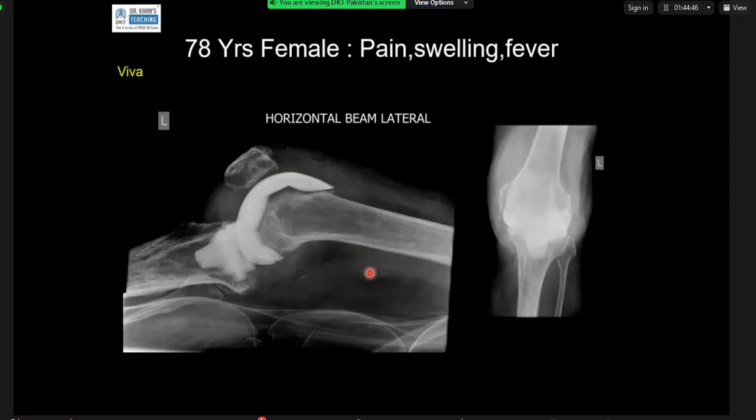Then I can see an interrupted periosteal reaction involving the medial portion of the femur with an ill-defined lytic lesion in the distal femur, corresponding to the anterior cortex. You're talking about this area where I'm pointing out? Yes, sir. So this is also projectional. This is similar to this. This is quite a bit of osteopenia. Okay.